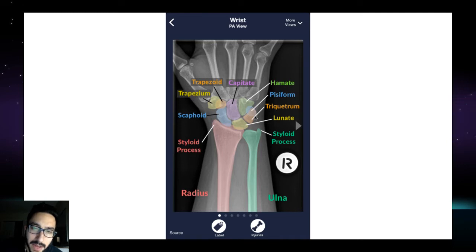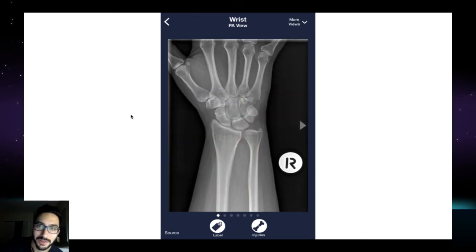And then, so that's the bottom row of four. The top row of four includes the trapezium, the trapezoid, the capitate, and the hamate. And exactly where this line is pointing to, actually, that's the hamate. And a funny mnemonic, actually, a little not safe for work mnemonic, but it's fun to remember these carpal bones. When I learned it, it was some lovers try positions that they can't handle. So that one always stuck with me. So the carpal bones were never that hard to remember.